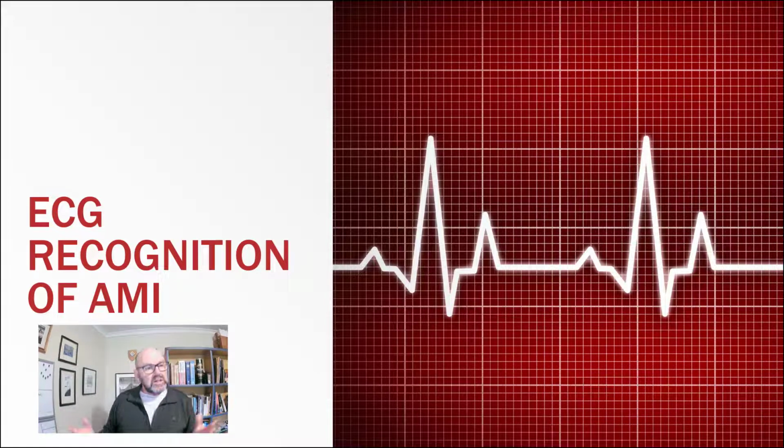Kia ora. This session is going to be reviewing the information we require from an ECG to help in the diagnosis of an acute myocardial infarction. While the main focus may be around the ST segment elevation, there are some other indications that might assist when we're dealing with patients who are having a non-STEMI event.